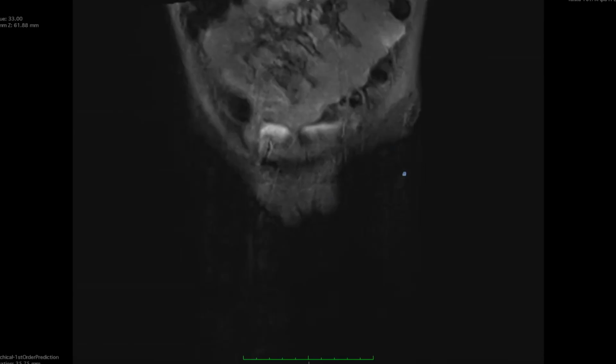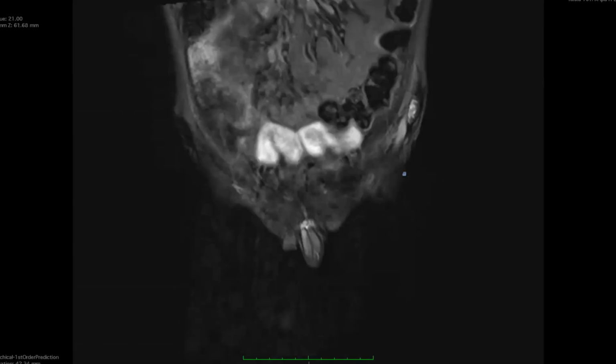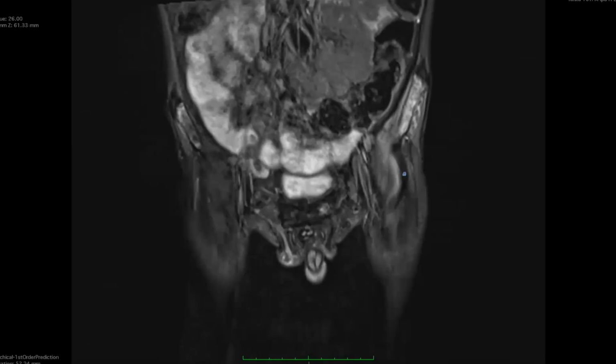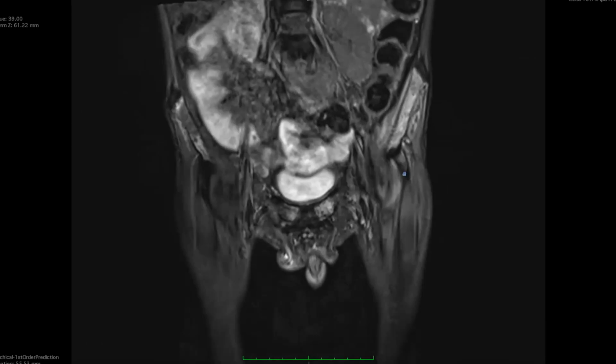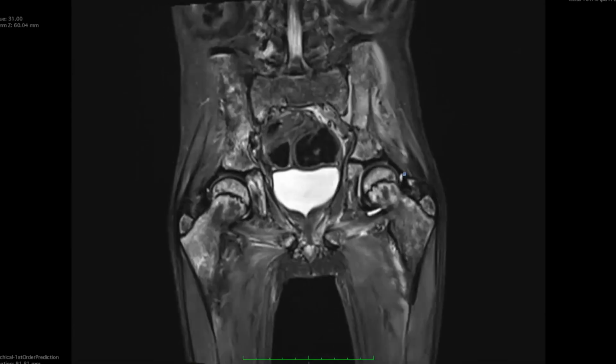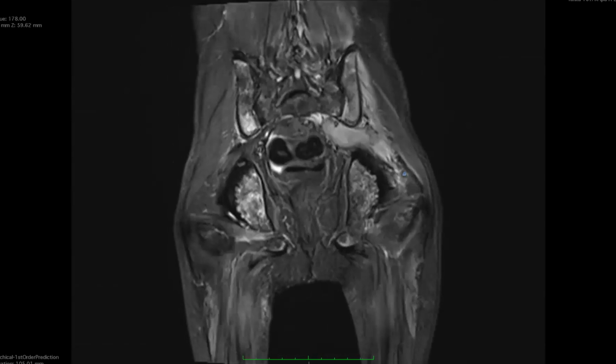Okay. Can I scroll? Yeah, of course, please. You said 11-year-old, right? Right. So this is an 11-year-old kid.